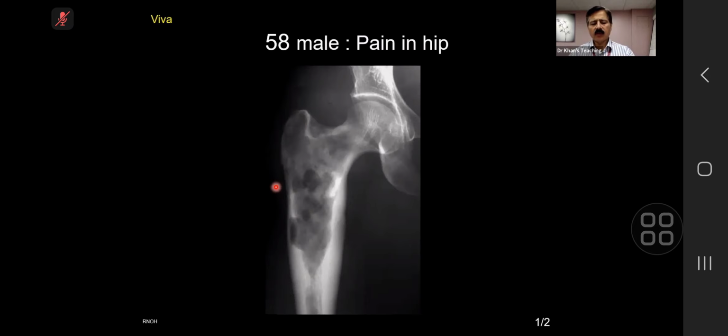And the third thing is MR criteria. On MR, remember that cartilaginous matrix has high signal, lobulated high signal. If you lose that lobulated high signal, that is taken as a sign of malignancy. But do not confuse it with calcification. The calcification will also be low signal.